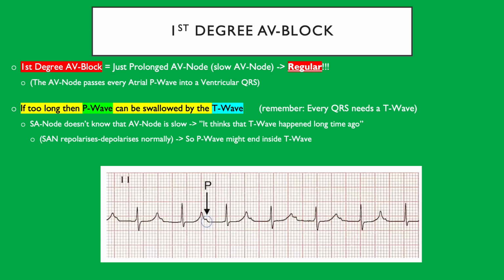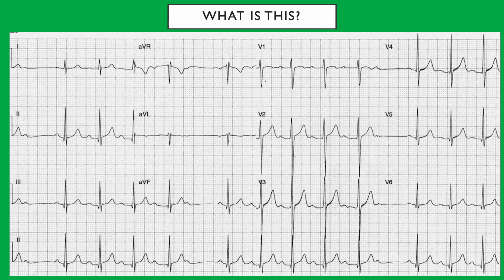It's not healthy. It's not. No, 3 to 5 is the healthy one. So it means that the AV node is slow, okay? So that's our pathologies. What is this one? Related to the PR interval, because we're doing PR interval now. It's very hard to see now. It's a look. Second block. Second degree block.